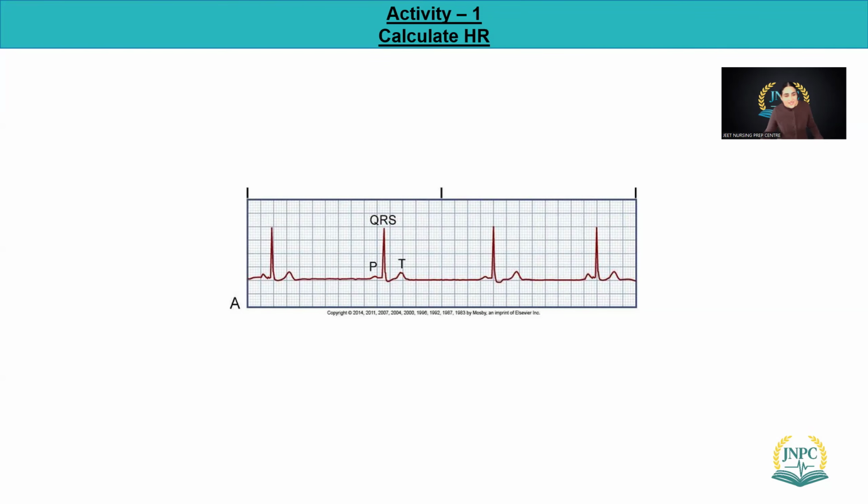Okay, let's see. First of all, do we see PQRST, PQRST, PQRST, and then PQRST? One thing is sure: PQRST is there. This is sinus. Before we call it sinus, we have to verify the other second part too.